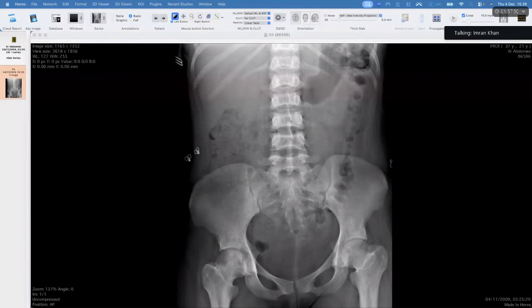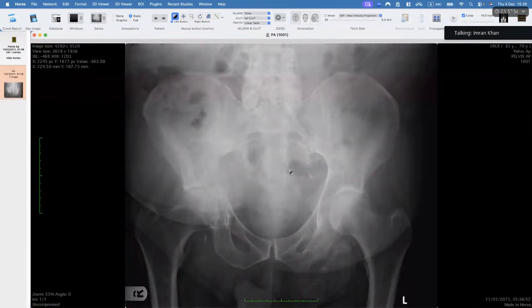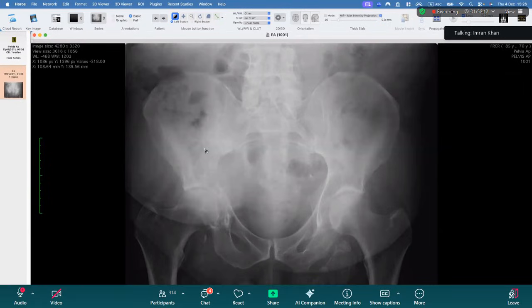Learn to see where the case ends. This is unfortunately a clear fail. And this is a difficult case for me to define. I was reflecting on how to evaluate you, right? Because you picked up the myositis ossificans, we'll come to that. But what you haven't picked up is this patient has got a large lytic bone lesion with a soft tissue mass hiding in there.